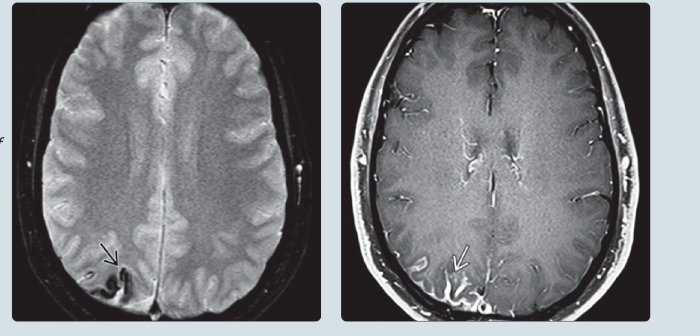This is a case of presumed, not surgically proven, meningioangiomatosis.